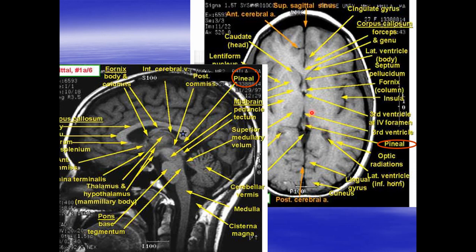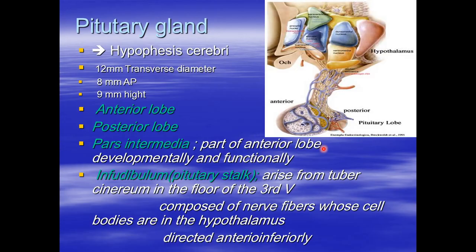Also you can see here, this is the left thalamus and the right thalamus, and in between them is the small tiny pineal gland, which most of the times in older age group it will be calcified, normally calcified, and there it is a site of some pathologies like pineocytoma, pineoblastoma, etc. We will not talk about it because we are concerned with the anatomical aspects.